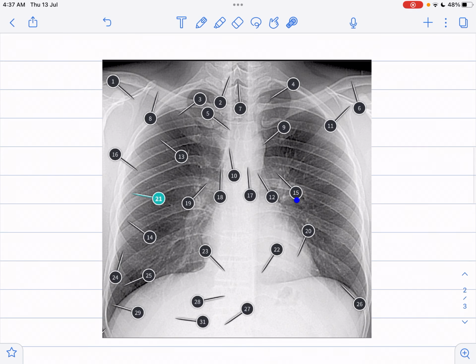In this diagram we are going to count the different bones as well. So let's start from the center. This one is the trachea, this little black one. Now let's start over here. This structure is the first vertebra. This is the first thoracic vertebra, this is the second thoracic vertebra, this is the third thoracic vertebra, fourth thoracic vertebra, fifth thoracic vertebra, similarly sixth thoracic vertebra, this is the seventh thoracic vertebra, eighth thoracic vertebra, ninth thoracic vertebra, and 10th.